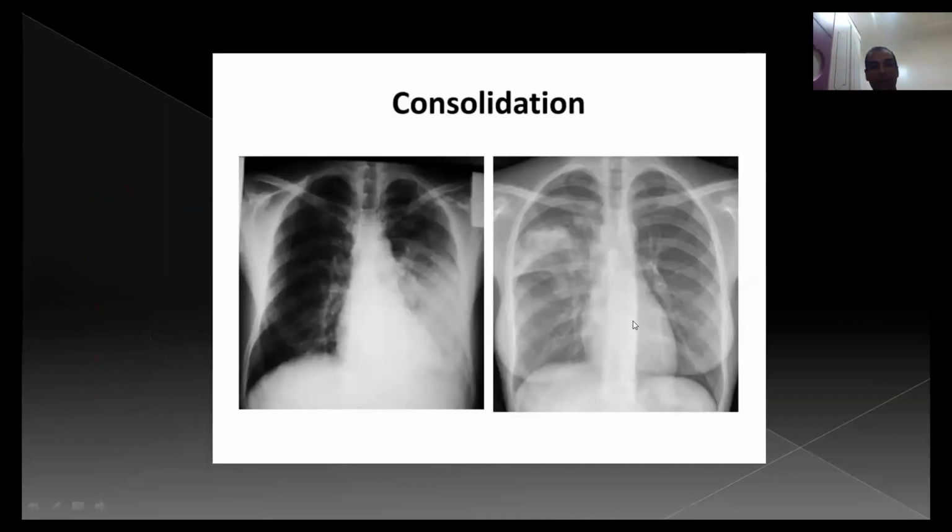Lung pathology, you can search for any consolidation in the chest. I think most of you know how to identify the consolidative patch. It is air space opacities. By the way, we have two different categories to visualize the lung pathology.